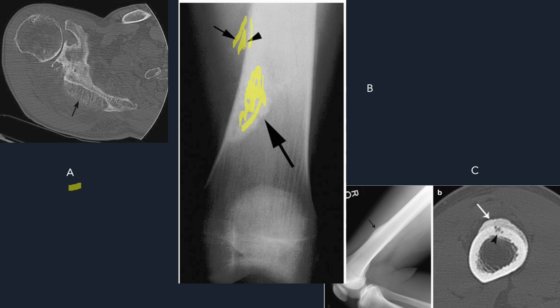Figure C pertains to an X-ray of the femur, which has a thick periosteal reaction. The thick periosteal reaction is very obvious on your CT scan. Take note, you can also see thick periosteal reaction in an infection. Now, it's really up to the physician, the residents, or the doctor evaluating the patient if this pertains to a possible infection or a possible primary bone tumor.